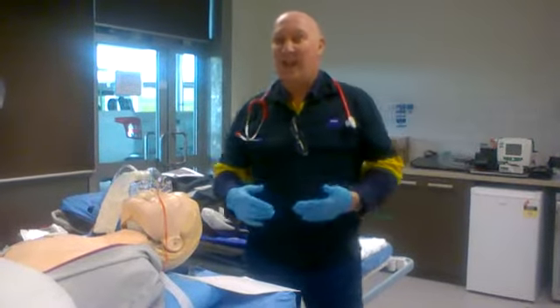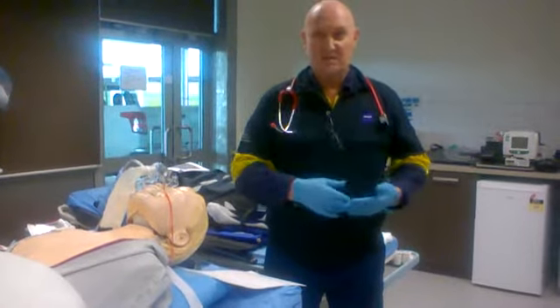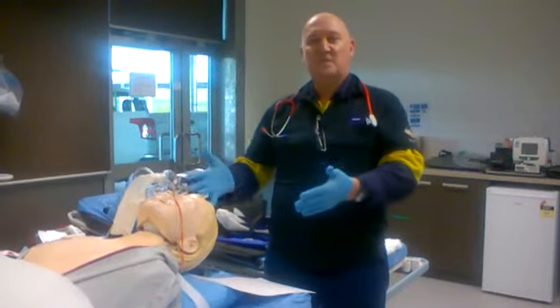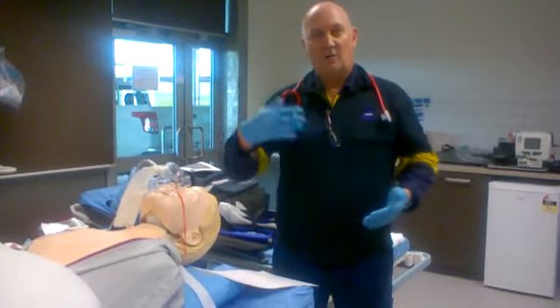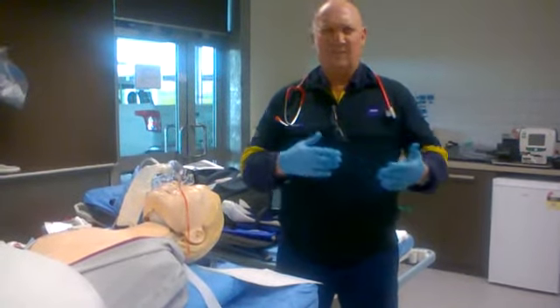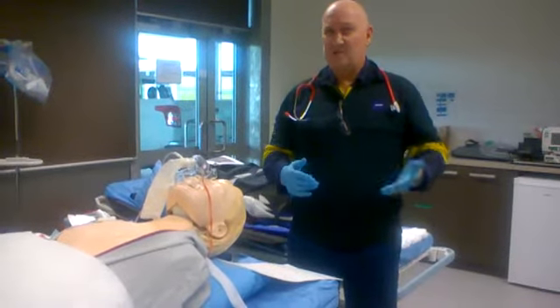Last time we talked about airway management and airway assessment. Here we're going to talk about anaesthesia, RSI, and capnography skills. As you can see, we're set up at the moment with a patient that I'll go through and explain. But first of all, it's about the stages of anaesthesia that Guedel identified and the depths in 1920.